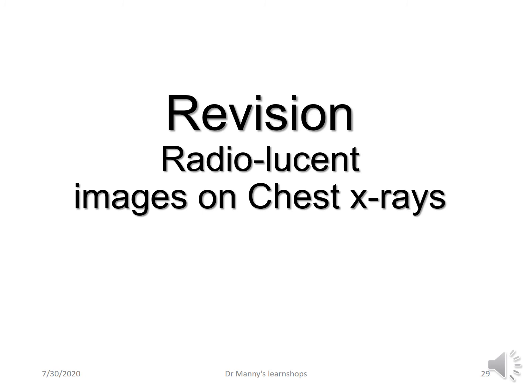Okay, so now let's see what you've picked up. Let's review black images on chest X-ray, radiolucent images.